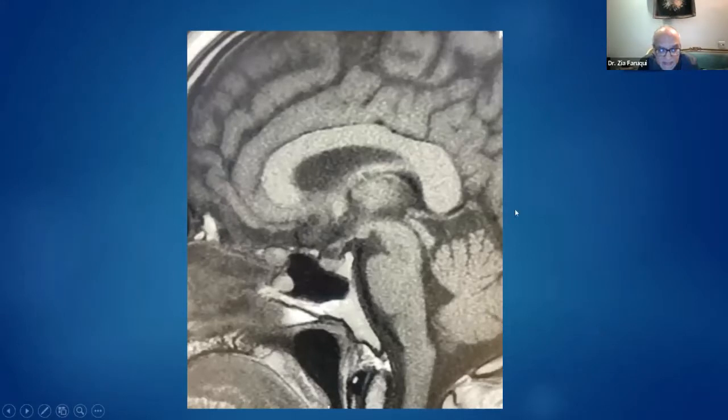Final case. कोई abnormality बता दे. This was something which we saw about 3 days ago. So the very subtle. आप पहले देख लें. If anybody can tell me, I'll give you a history. But have a look first. If anybody can pick up the abnormality.